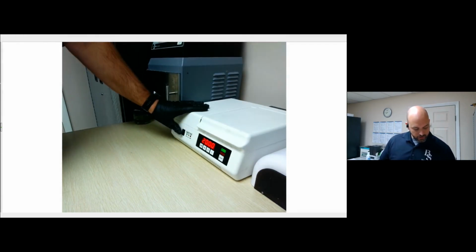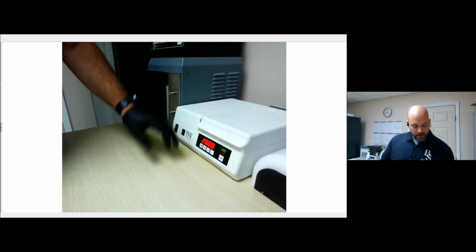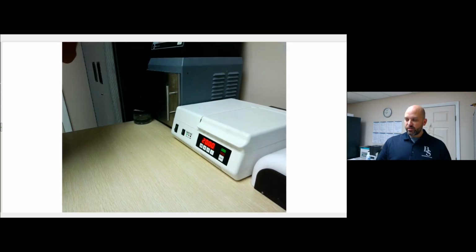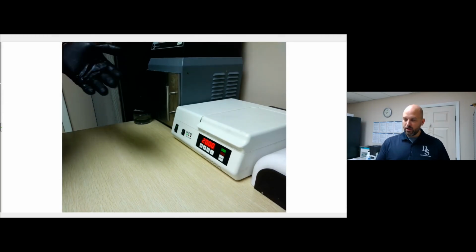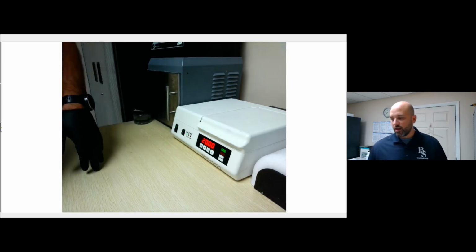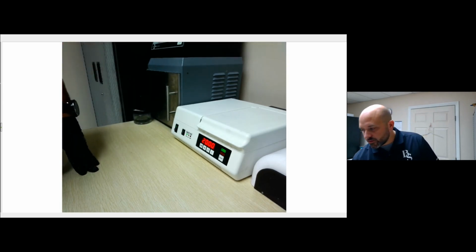Close the chamber, turn on my gas, and go ahead and hit start. So once it finishes the flashes, then I'll flip it around to face the front, and then I'll do 2,000 flashes again, and then from there we'll finish it. So we'll come back once this cure box is done, and we'll go ahead and start the finishing.